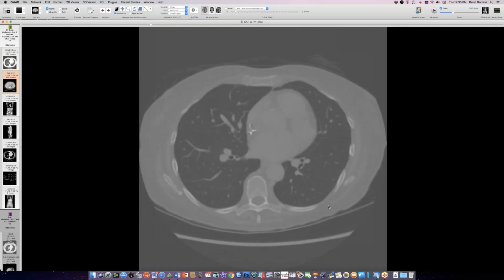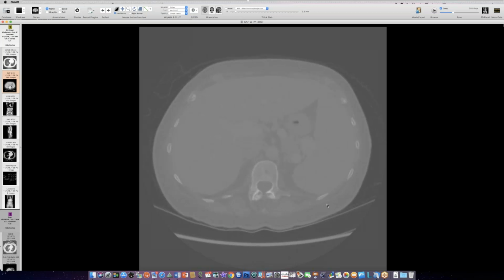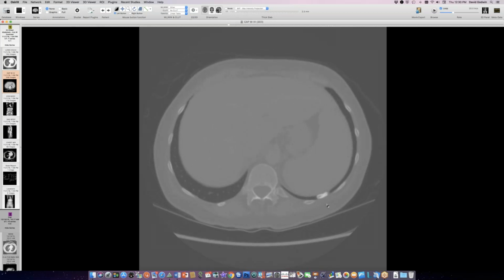So the explanation that the authors considered most likely is some fat up here. There's more fat on the left than the right, and there are more thoracoliths on the left than the right. So maybe it's coming from this anterior fat that somehow infarcts, calcifies, gets into the pleural space, and then drops into these more dependent locations. So we've got a thoracolith, but the rim calcification gives me a little hesitation to attribute this to something that came from epiploic fat.